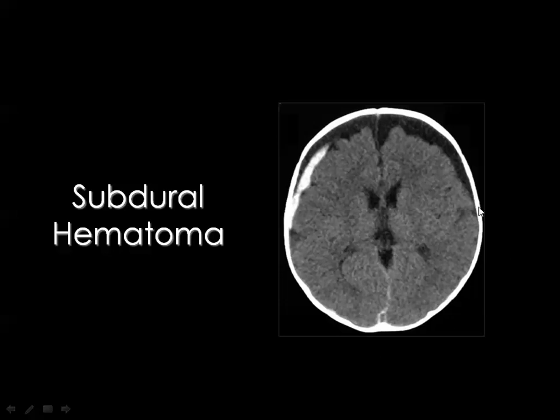And this is what we call subdural hygroma and hematoma. Hygroma means accumulation of CSF in the subdural space. You know, the CSF is present in the subarachnoid space, but in some cases of trauma, there may be tear of the arachnoid membrane, resulting in leak of CSF into the subdural space, and this will lead to the formation of the subdural hygroma, which is one of the traumatic sequelae.